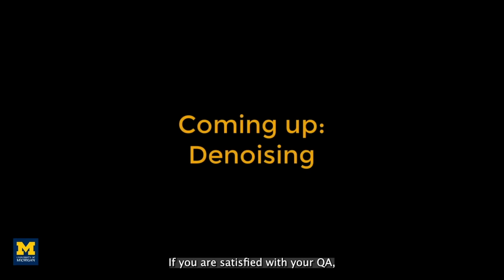If you are satisfied with your QA checks, you are now ready to begin denoising. This will further clean up the data using processing specific to resting state data and prepared for statistical analysis.